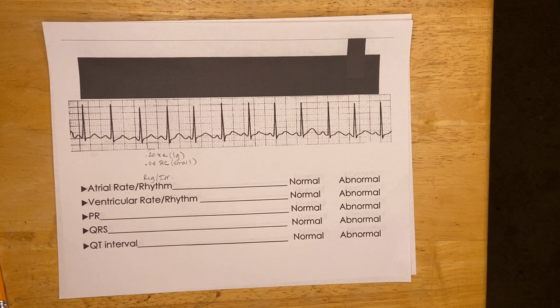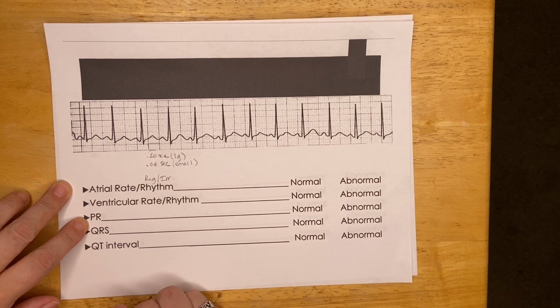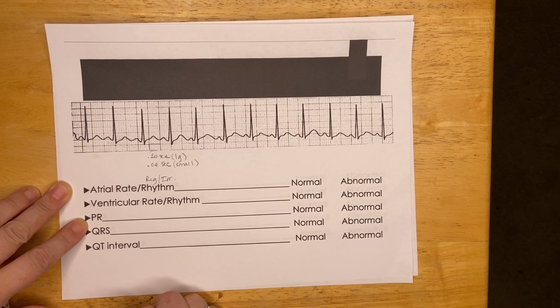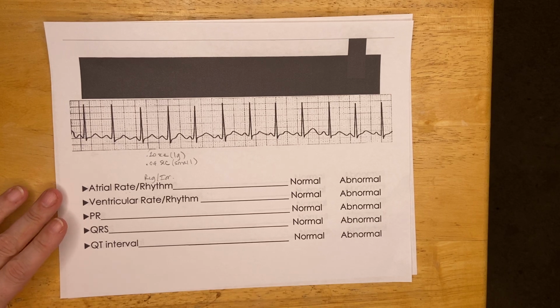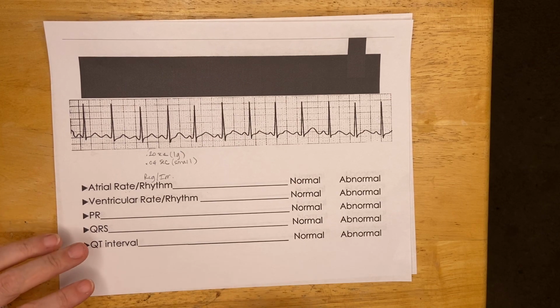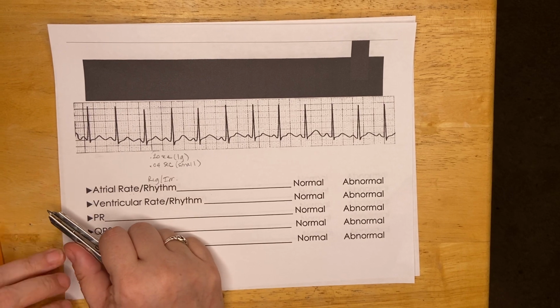It represents the electrical wave that should result in a contraction. So when you are looking at this, you're not looking at heartbeats. You're looking at electrical impulses that should result in a heartbeat. More about that later in the semester. But that's an important distinction to remember, that you're only looking at the electrical activity, not the mechanical activity of the heart. So my task is to figure out where the P waves are.